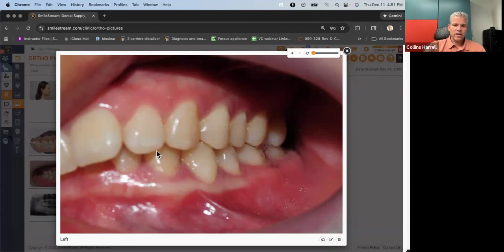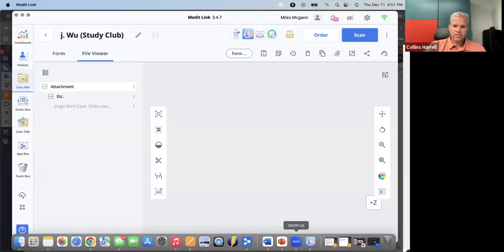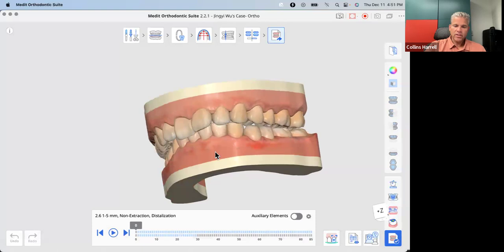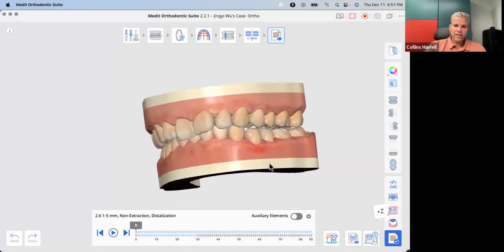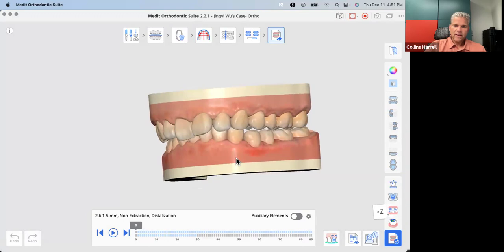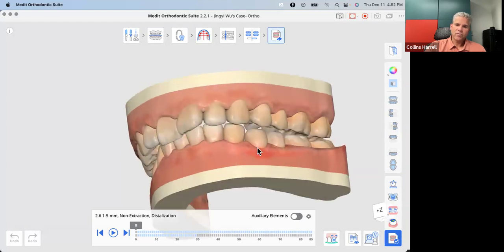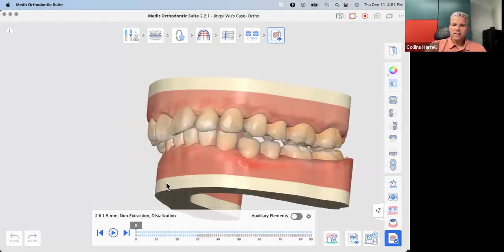If I walk straight, I would hit the lateral incisor. So if I go back over here and I'm coming from an inferior view, a little bit like that, I'm coming straight at that lateral. It almost seems like we're from that type of an angle in the photo. The photo is from like here back. That's what makes me wonder if we have the same bite.